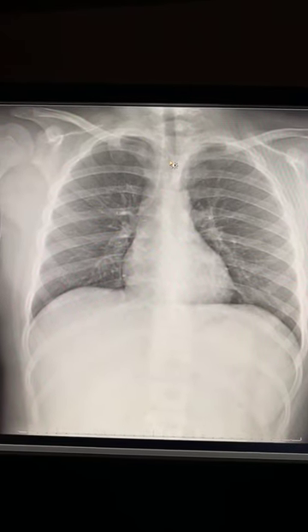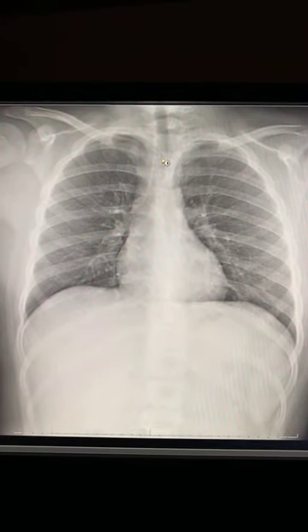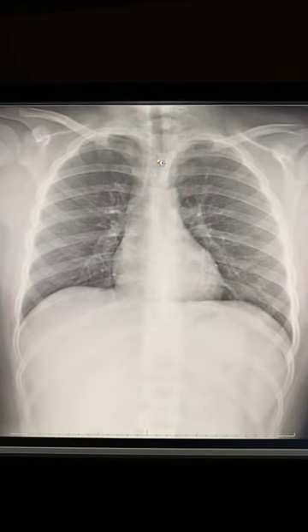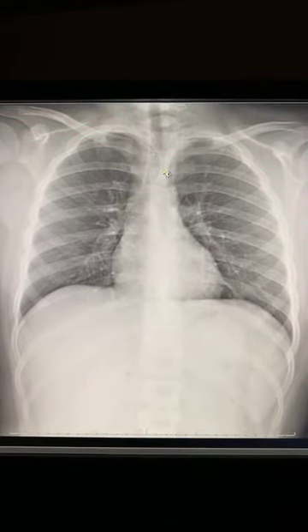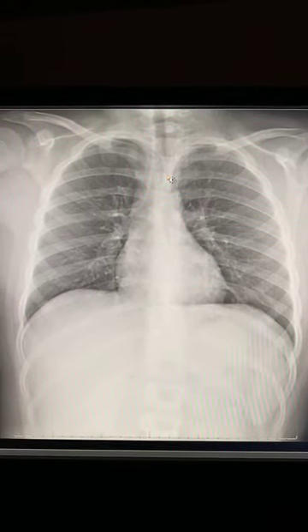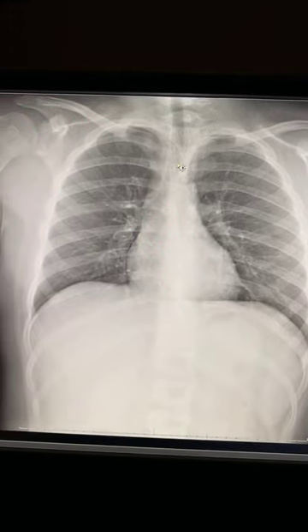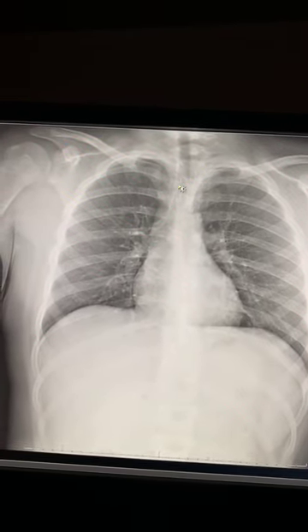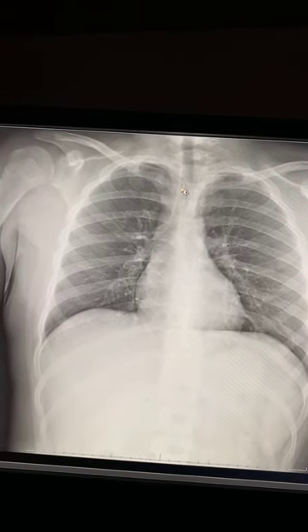Number two, everybody's favorite question. The attendings, when you're upstairs rounding on the medicine floor, are going to pimp you on this. They're going to say, hey, is the patient's chest x-ray rotated? And you're going to say, I don't know, maybe he's a little to the right. No, wait a second, maybe he's a little to the left. Here we go, Radiology 201. So how can you tell, right? You're not really looking at the trachea because the trachea can kind of move around.